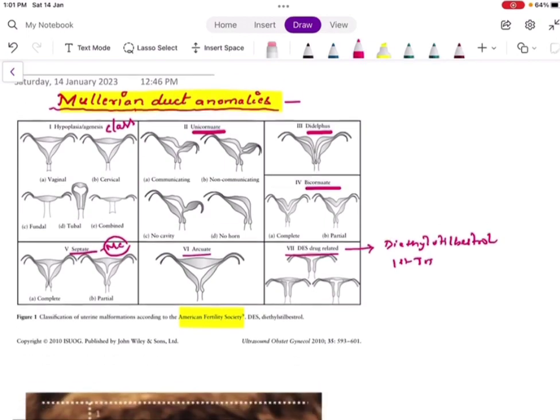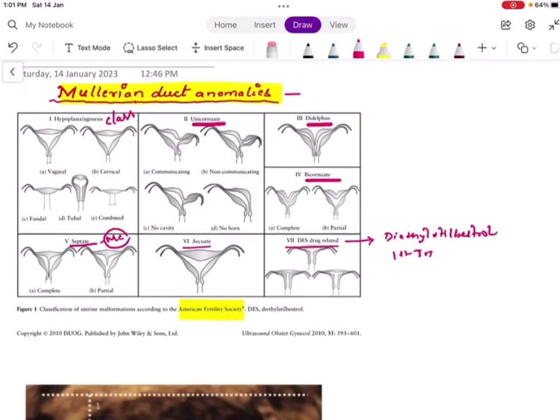What we get here is a narrowing and irregular endometrial cavity with constriction bands, that is known as the T configuration. The uterus is small, hypoplastic. The fallopian tubes suffer from stenosis, saculations, and shortening. And remember, this drug related uterine anomaly is not associated with urinary tract abnormalities.